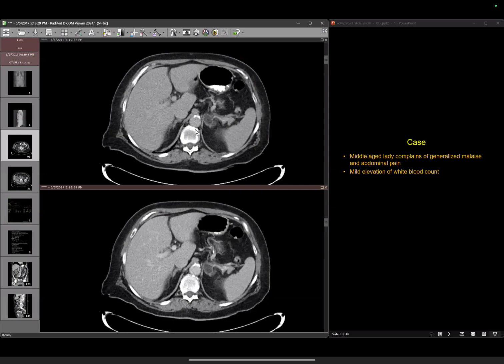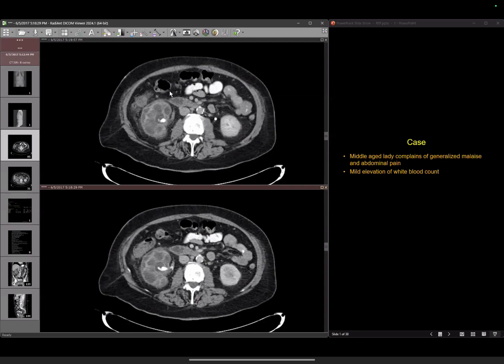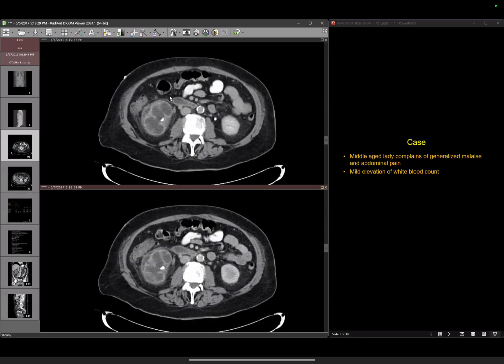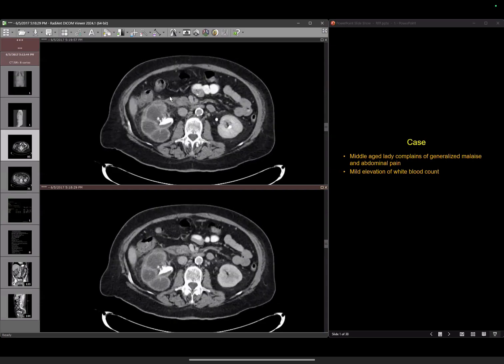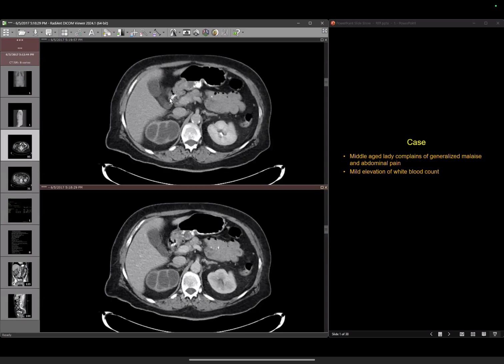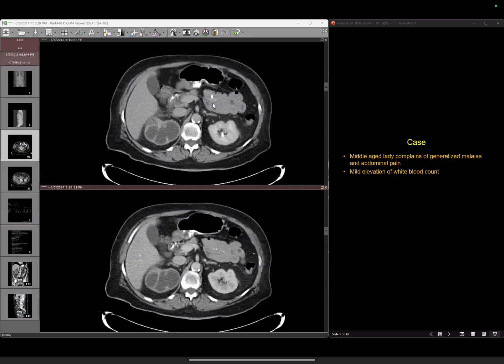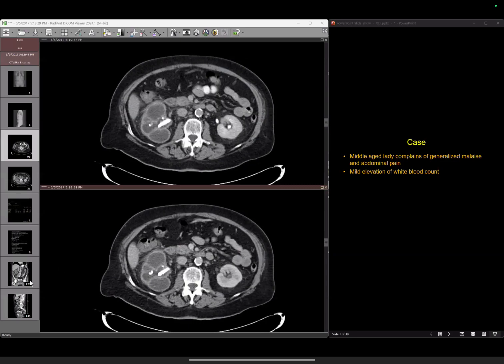So let's synthesize everything. So what would your impression say in your CT? What would your final impression be? So, staghorn calculus with upstream dilatation of calyces and pelvis of the right kidney, along with surrounding fat stranding, suggestive of pyelonephritis. Xanthogranulomatous pyelonephritis. Yeah, excellent.